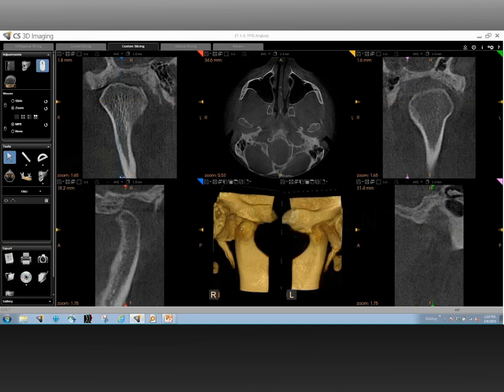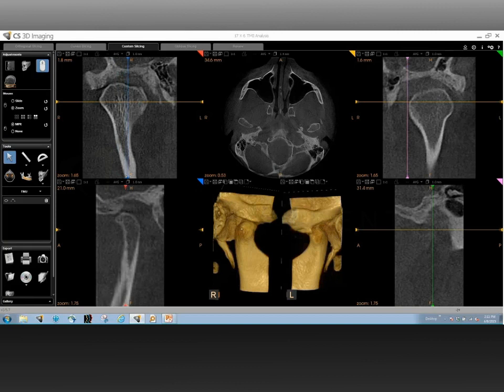If you notice, again, I'm going to stop right there, show you some sort of flattening on the superior head of the condyle, the superior anterior portion of the condyle. Almost looks like the contralateral side. For the sake of consistency, we go back all the way to the medial pole, and just let's go ahead and stop there.